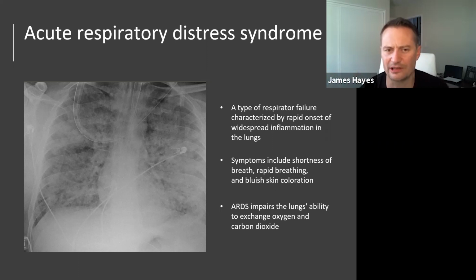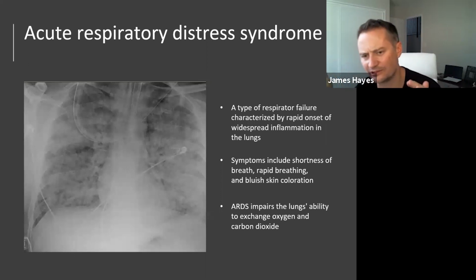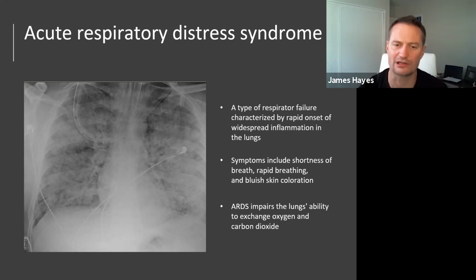But that shows you that the patient can't stand, because any patient that can stand is level, okay? The right and left lung are level within a couple of millimeters. This one isn't. So this one's either sitting slumped to the side or they're lying on their back. Okay, so this patient is very, very unwell.